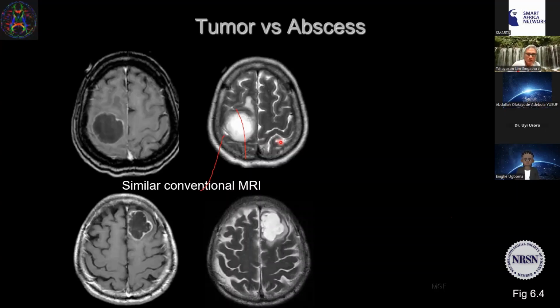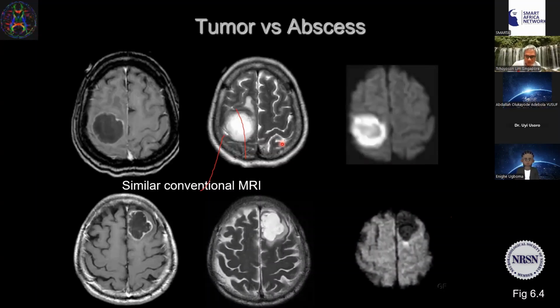So how can we tell the tumor patient from abscess using MRI pulse sequences? Here we can see that the diffusion-weighted MR imaging is different in the two conditions. In a patient with an untreated abscess, the restriction of diffusion usually has high DWI signal and low ADC, whereas the classic metastasis typically has low signal on DWI.